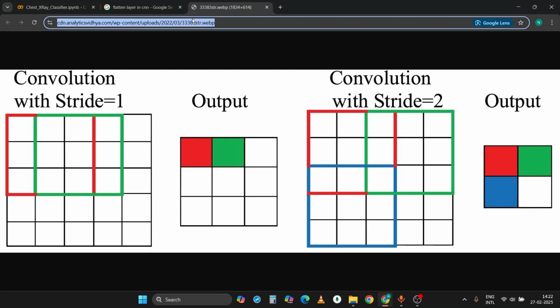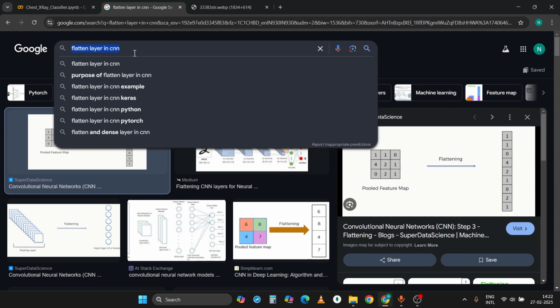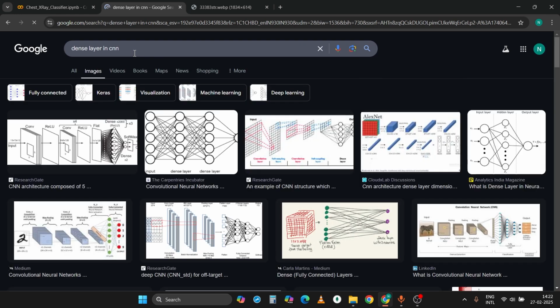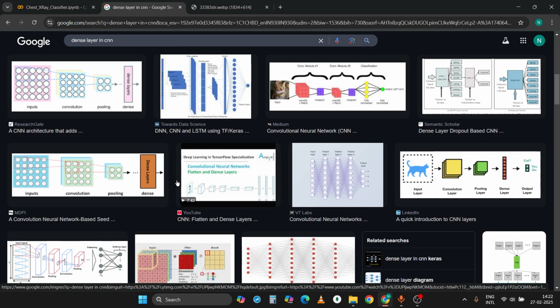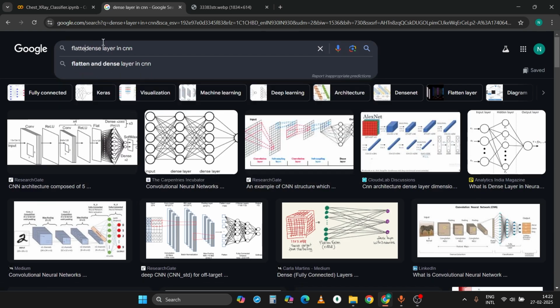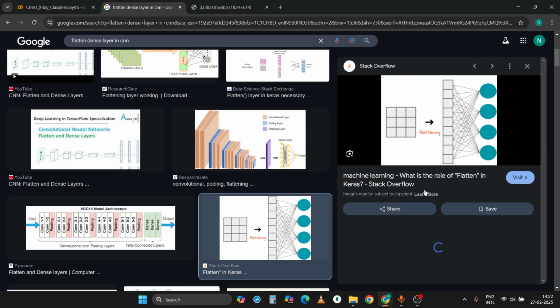Let me show you this also. See, this image is perfect.